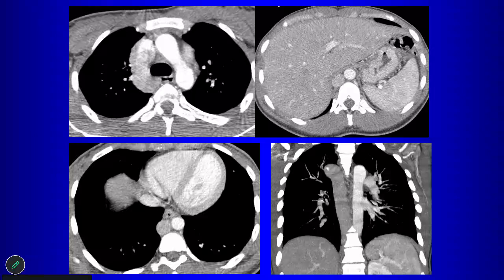Well, what did you mention? So is this azygos continuation of the IVC? Yes. How do you know? You see on the right side, the right image, the continuation. So this is the azygos vein here, but what's the key to making the diagnosis of azygos continuation of the IVC? Absence of the intrahepatic inferior vena cava.